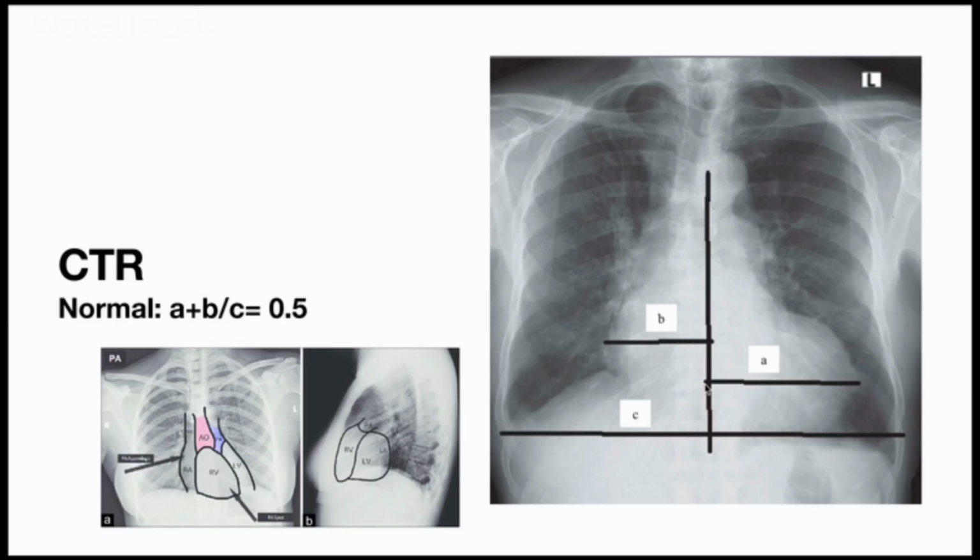Now it's also important for us to notice that the cardiac size may be evaluated by using what is called a cardiothoracic ratio.